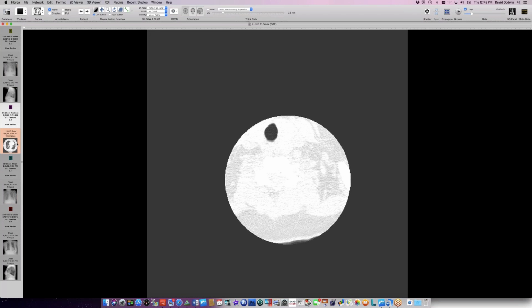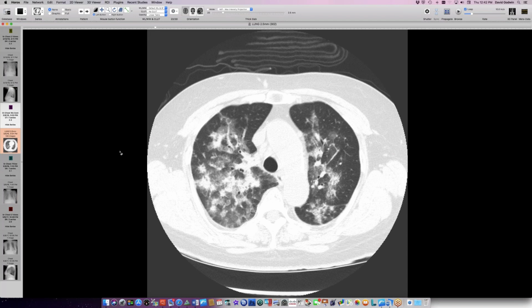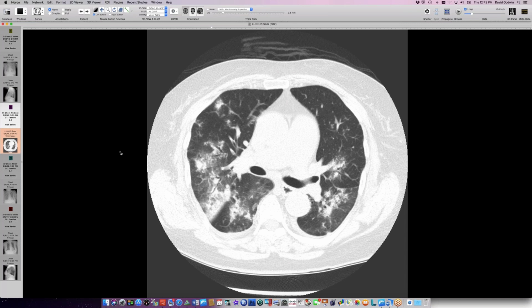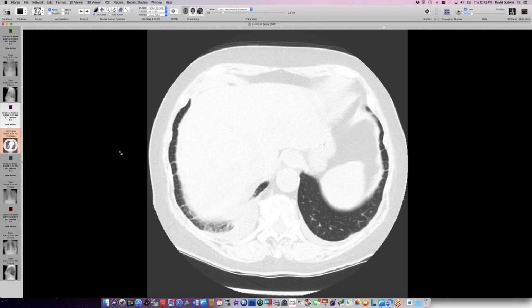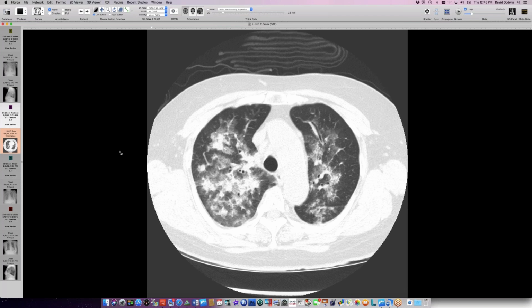Had the CT scan fairly early and has this patchy consolidation, which is mostly central and seems to be around airways. Person was coughing up some blood, was bronched, and they identified pulmonary hemorrhage here, and there were biopsies done.